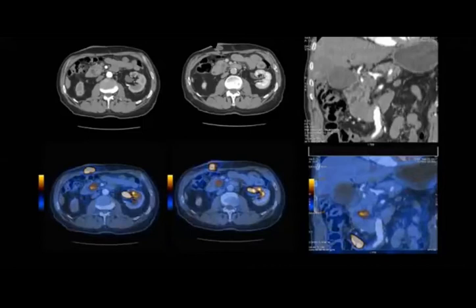Maybe just you can see this. What is this? What do you expect it to be? Metastasis. Could be metastasis, but from the history, I told you something that maybe you will think about something related to bladder cancer. If this patient had a radical cystectomy, and you know that the FDG tracer goes through urinary excretion, so what do you expect this one to be?